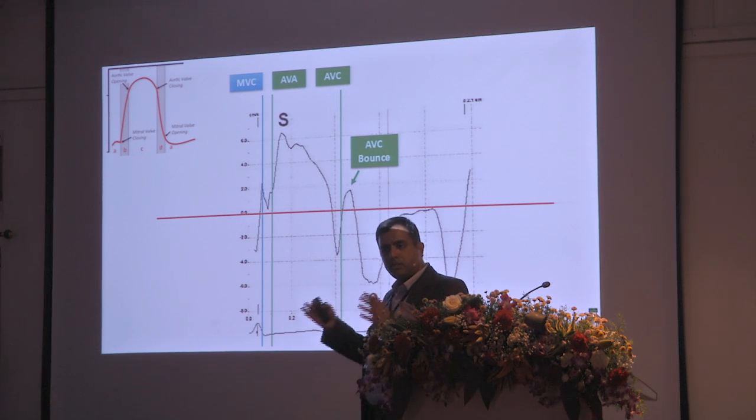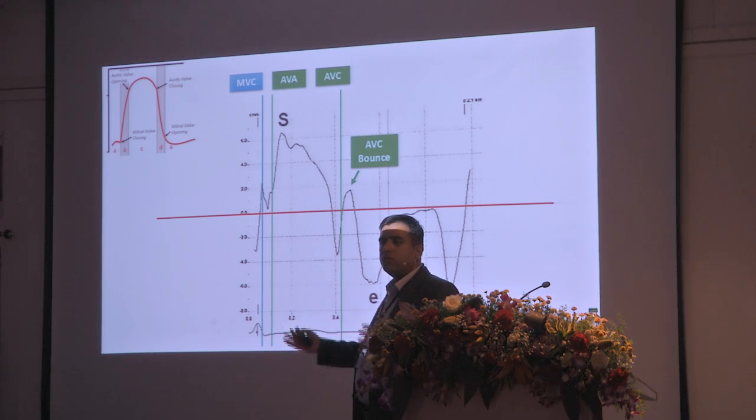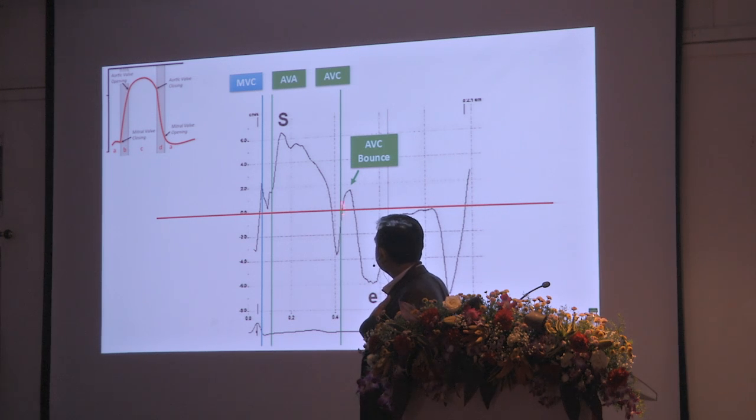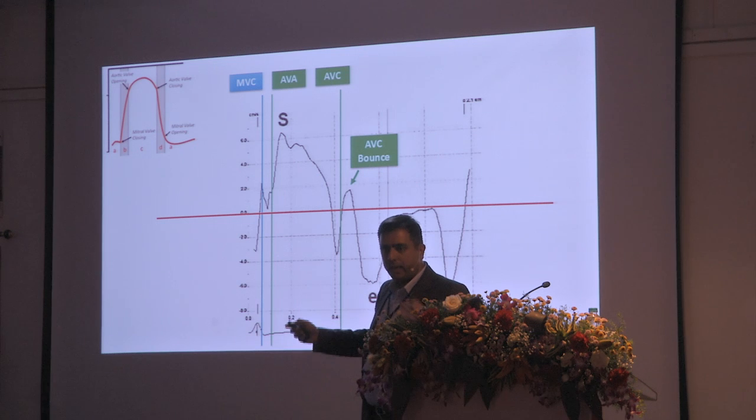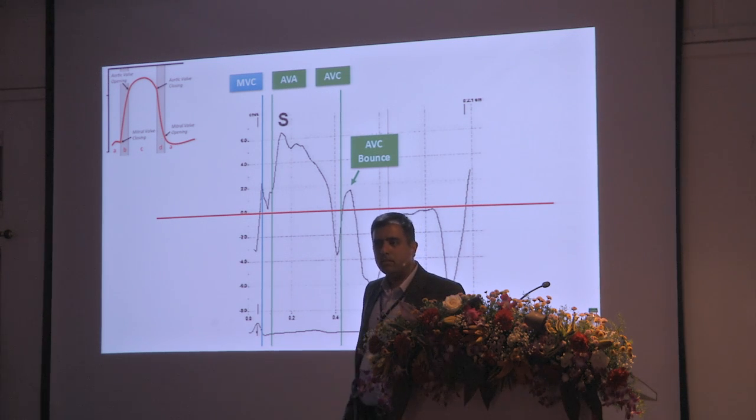This is the place where systole transitions to diastole. So the first thing I do after establishing my baseline is to find this point of aortic valve closure. Thereafter, I do everything else. But proceeding forward, I have identified the point of aortic valve closure there, and I want to know when the mitral valve opens.